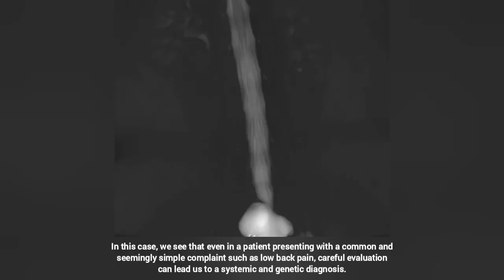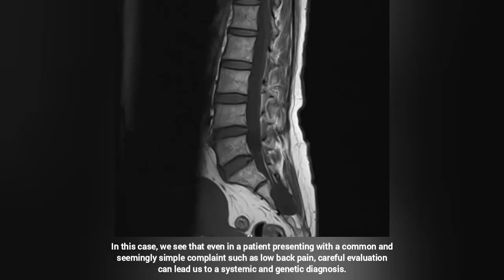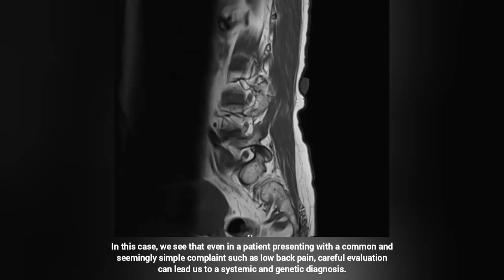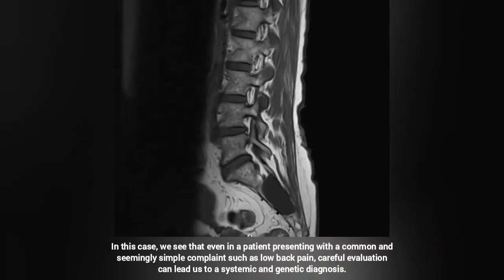Today, we are reviewing the lumbar MRI images of a 50-year-old female patient who presented with low back pain. First, I am starting with the T1 weighted sagittal images. In the sacral region, there is a lesion measuring approximately 5 centimeters in diameter, appearing hypointense on T1.